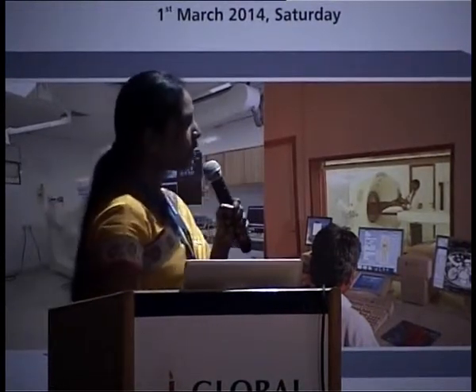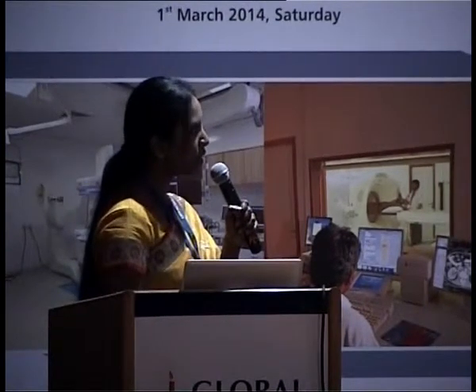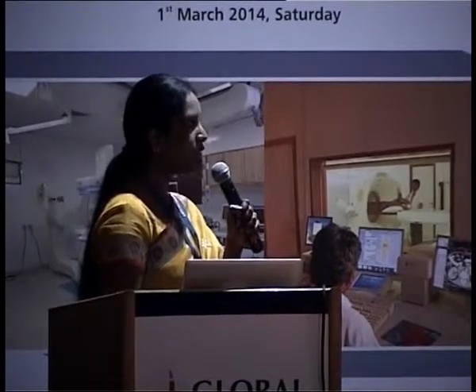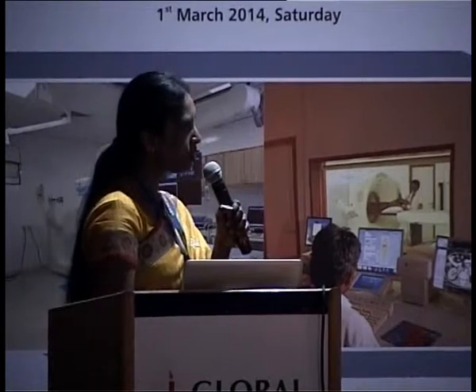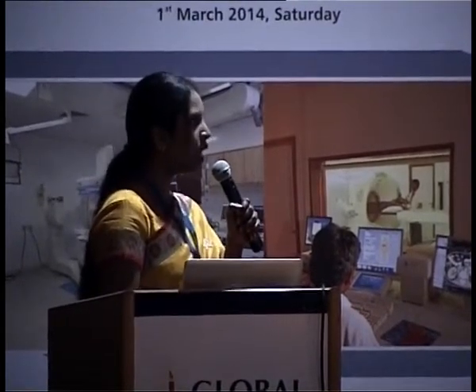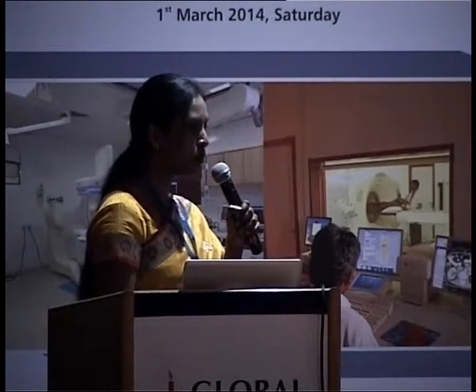Again, I've got a range of slides wherein you can see this is a completely normal liver. This is again, you can see that there are some septations, these are reticular markings in an early cirrhotic liver. And if you see this particular picture, you can see some early nodules. So these are probably regenerative nodules in a cirrhotic liver. And as we move on, you're losing the vascularity in the liver again because of the abnormal perfusion.